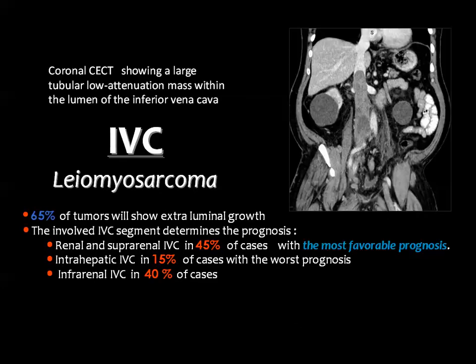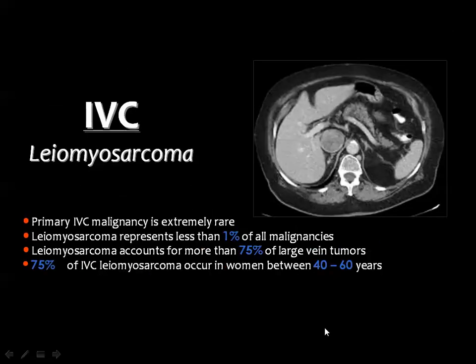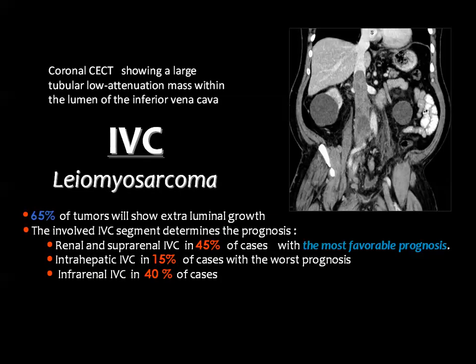How can you differentiate the tumor thrombus from the bland thrombus or the regular thrombus? And this is one of the important issues. You remember that I have mentioned that the tumor thrombus will expand the vein, the tumor thrombus will enhance with contrast material, the tumor thrombus will show metabolic activity, and this is a tumor thrombus affecting most of the IVC.